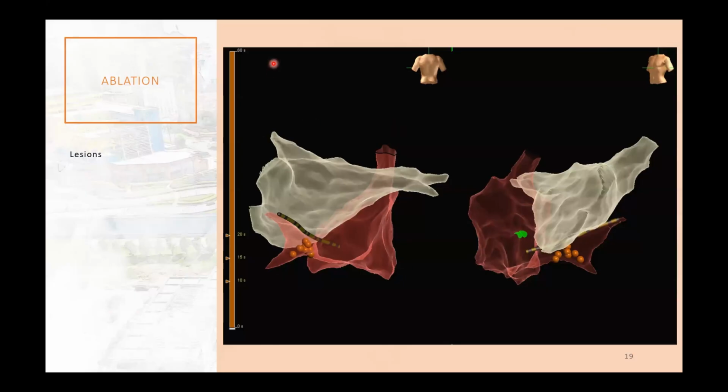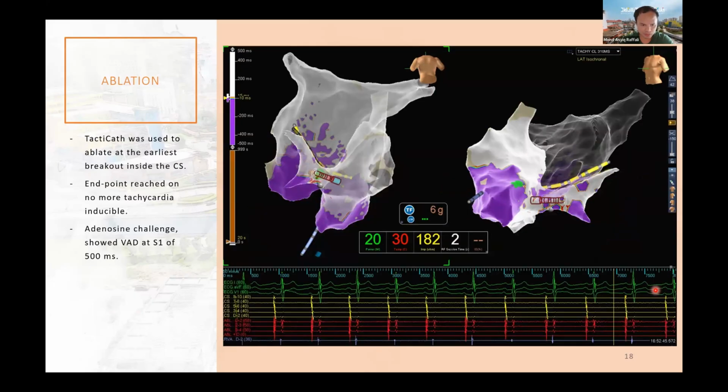Can I ask a question? Do you have your cine position with your catheters? Where did you deploy the CS venogram? Unfortunately, the images were not saved. But the positions are quite standard, as you can see from the 3D map here. Where's your RV catheter? The RV catheter is in the standard position. I'm not sure why it's not here in the map.